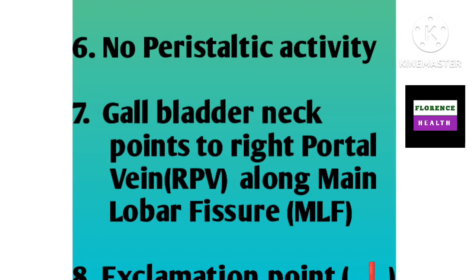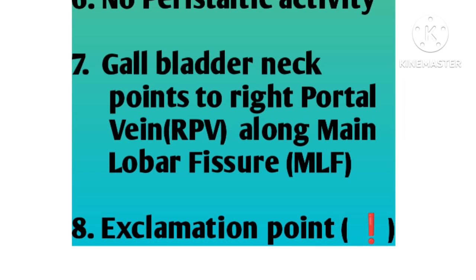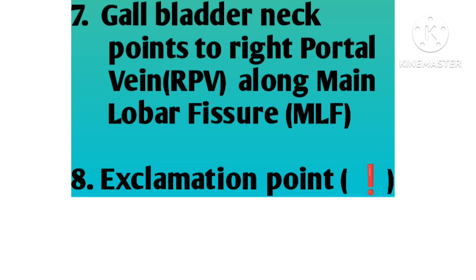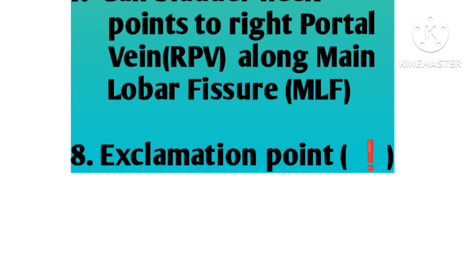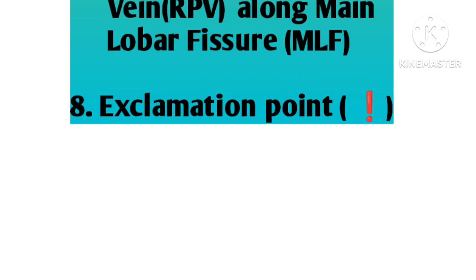Eighth point, that is the last point, the exclamatory mark or exclamatory point. Collectively, the gallbladder, main lobar fissure and portal vein have the appearance of an exclamatory mark, which will be discussed in a later part of this video.